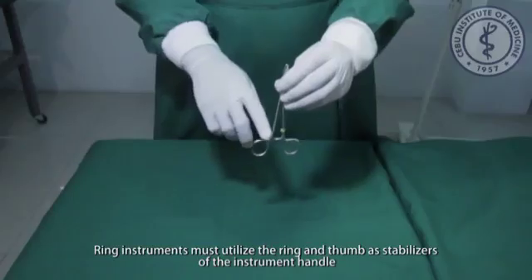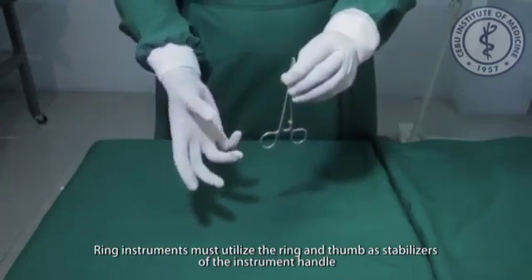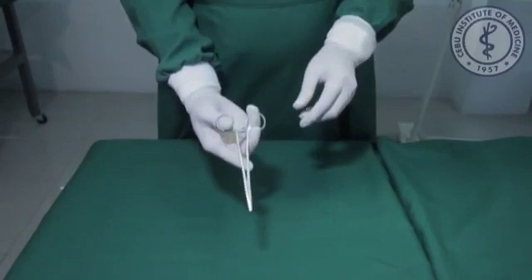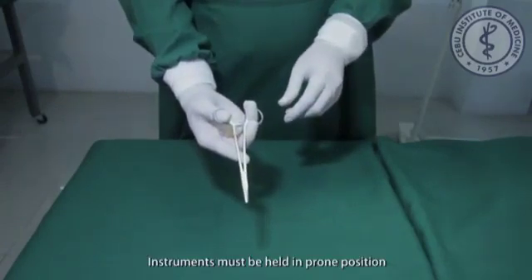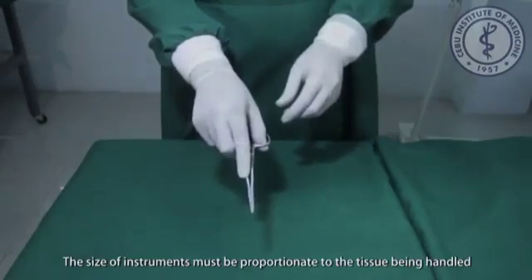Handling of surgical instruments. General guidelines. Ring instruments must utilize the ring and thumb as stabilizers of the instrument handle. Instruments must be held in prone position. The size of instruments must be proportionate to the tissue being handled.